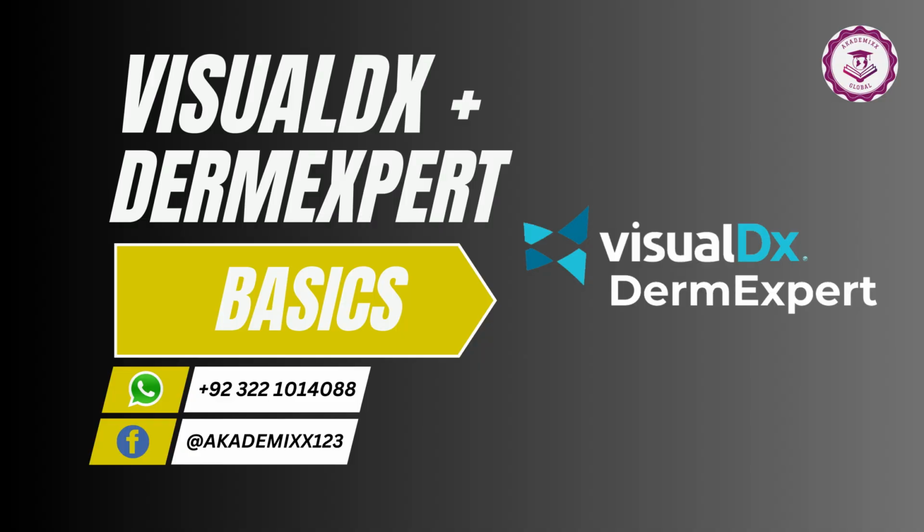Today we are diving into VisualDx plus DermExpert, a powerful tool for clinical decision support, especially in dermatology and differential diagnoses. Whether you are a medical student, a resident, or a practicing physician, this platform can save you time and improve diagnostic accuracy. So let's get started.